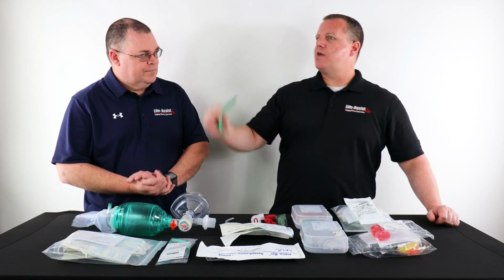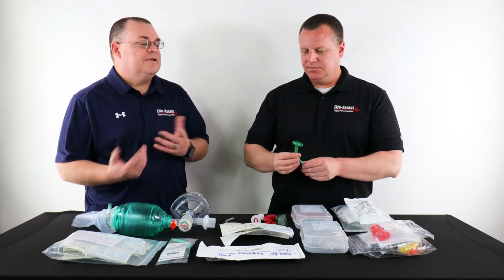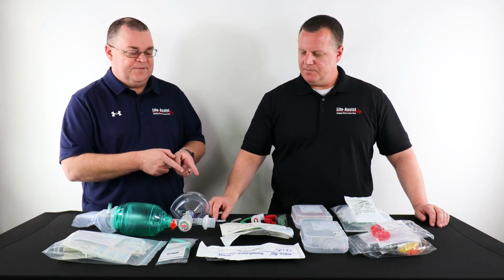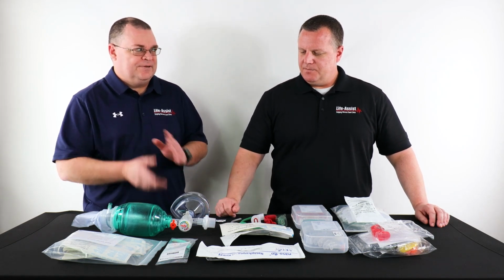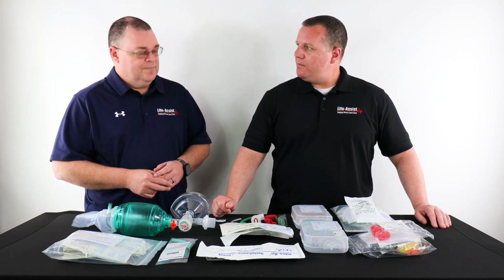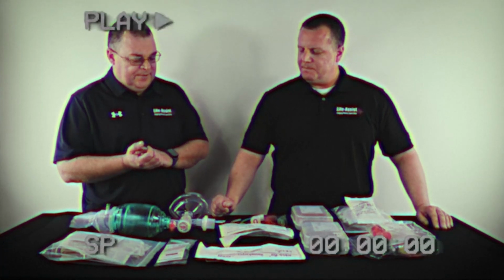So you're going a different route into the same area. You got it. And that one sounds a little more intrusive. Is it still basic license? It isn't. Same thing: EMTs, paramedics, they can all use these devices. Awesome.